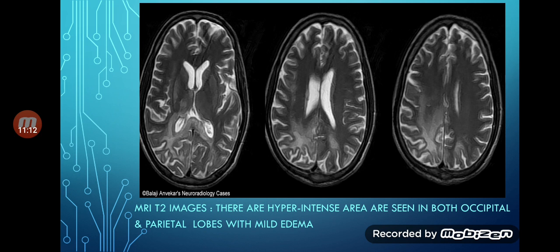We can exclude infarction because it's bilateral, and infarction involves the territories of an artery, not jumping across multiple areas of the brain. This is how we can differentiate this image from infarction or an underlying brain tumor. This is the imaging of encephalitis.